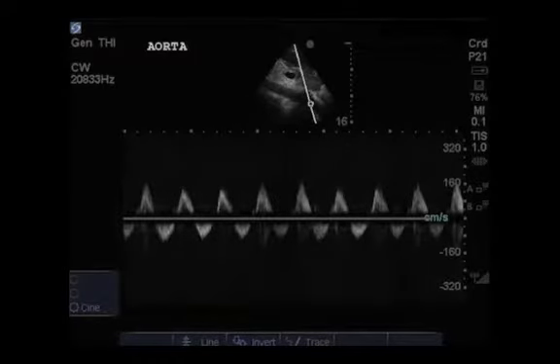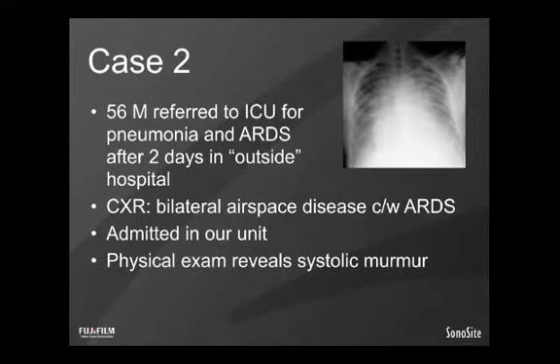On an advanced level, there's some advanced assessment of severity, which you can do easily, especially if you're already familiar with aortic assessment in the abdominal aorta using pulse wave Doppler. A continuous wave could also be used in this particular image to look for reversal of flow during diastole, indicative of severe aortic regurgitation. This is an interesting finding that generally says the bottom is falling out of this patient's circulation due to the severity of the aortic regurgitation during diastole.